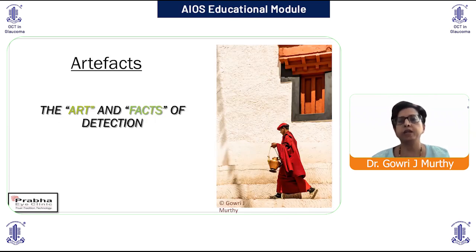However, as in the use of any technology, the knowledge of strengths and limitations of the technique, recognition of artifacts and errors in image acquisition, and accurate interpretation is very important. In this discussion, I shall show you various imaging artifacts in ONH and RNFL imaging, which could influence the interpretation. I will use examples from the spectral domain OCT, that is the Cirrus HD OCT, and the Spectralis from the Heidelberg Engineering Company. The principles of identification of artifacts are, however, similar across all the available platforms.